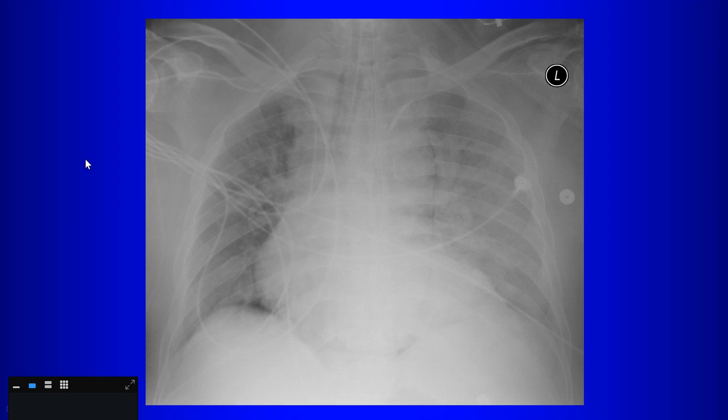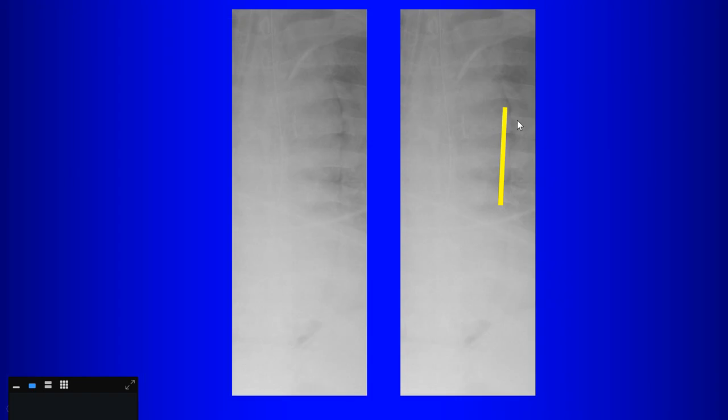Well, if you look at this radiograph, is this a pneumomediastinum? There seems to be a lucency alongside the descending thoracic aorta, and we do get calls from referring physicians who see stuff like this, and they ask if that's pneumomediastinum. The interesting thing is, if I just cover that edge of the aorta, that lucency seems to disappear, right? So what is it that we're looking at here? What do we call it? This is a Mach effect, right?